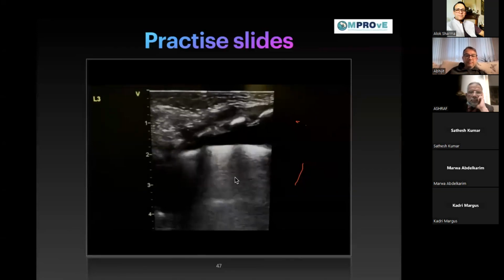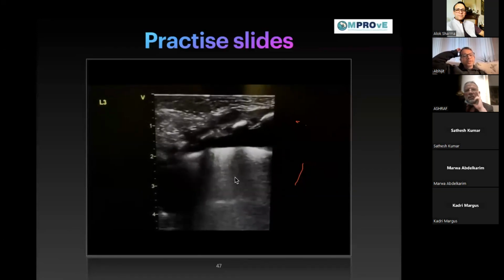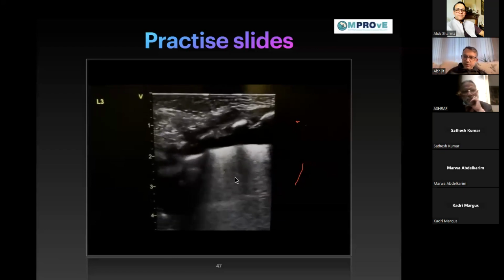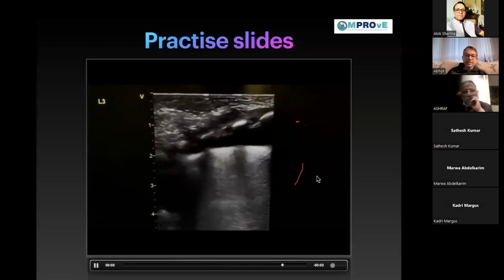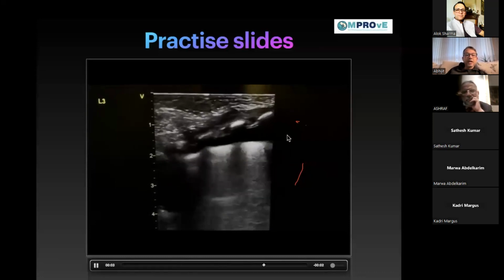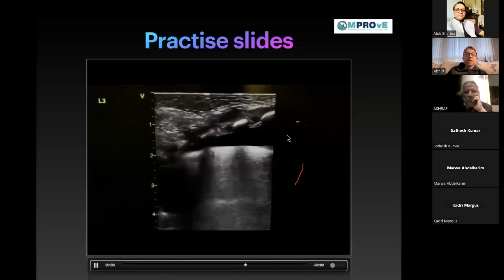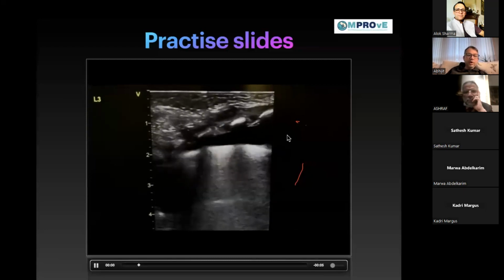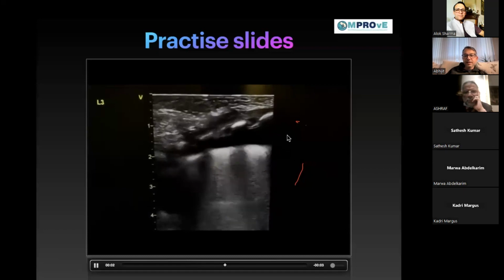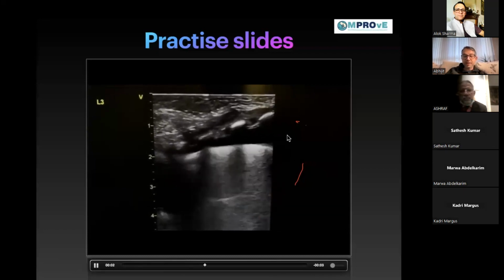Right. Next one. Now, somebody asked me a question. Sorry, I don't know who asked because I can't see you guys. Very sorry about that. But one of you asked me about chylothorax and how the lungs look. If we Doppler the area, are we going to see any vessels there, or might it be a normal lung or a collapsed lung?